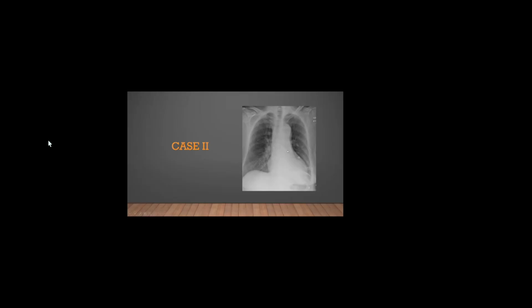See here on the chest X-ray, that is an example where we could see the calcification and the aortic knuckle is being displaced inwards. So that is the aortic knuckle. We could see the calcification here. It should be peripheral, should be mural, but in this case it has been displaced inwards, which of course suggested that something is happening.